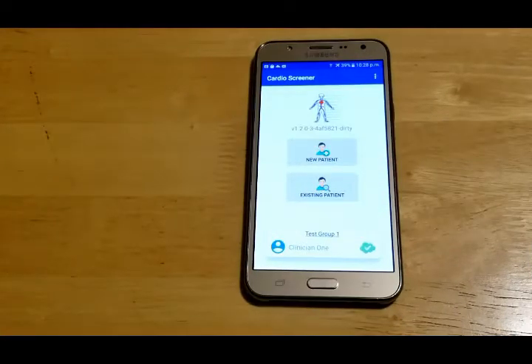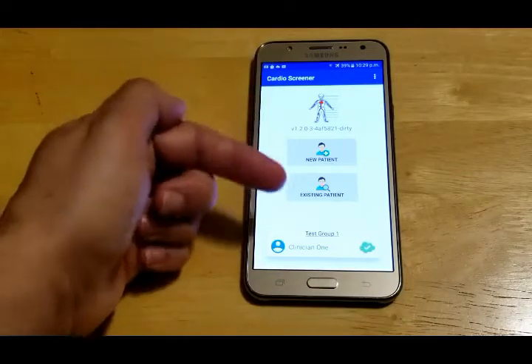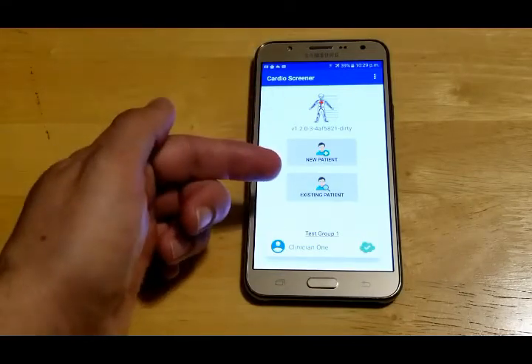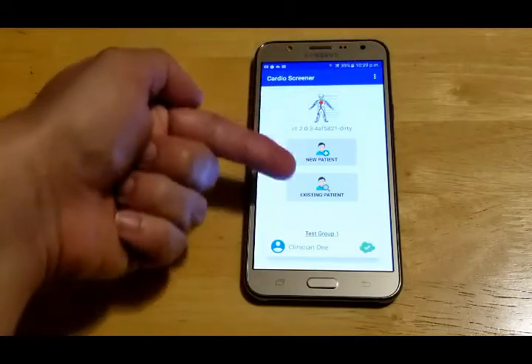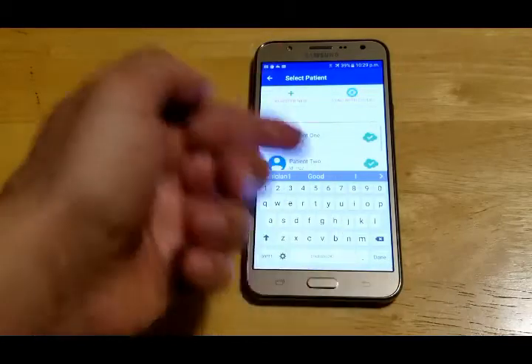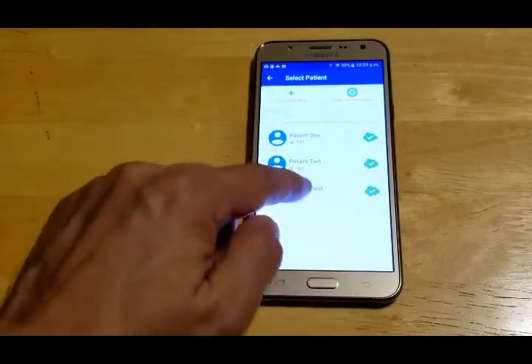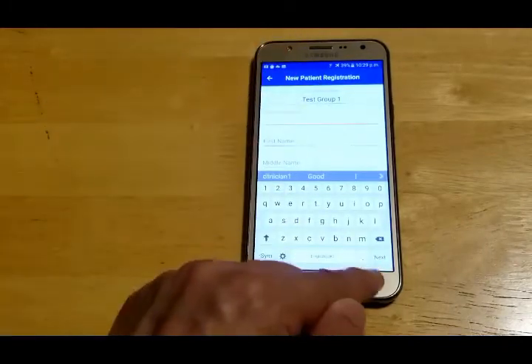In this video, we demonstrate how to anonymously collect measurement data and also how to anonymously analyze that data. As we have shown in previous videos, the Mobile Technology Lab software can be configured in clinical mode, and this is used to do clinical studies. As you can see here, we can select an existing patient and do measurements, or we can work with a new patient and do a registration.